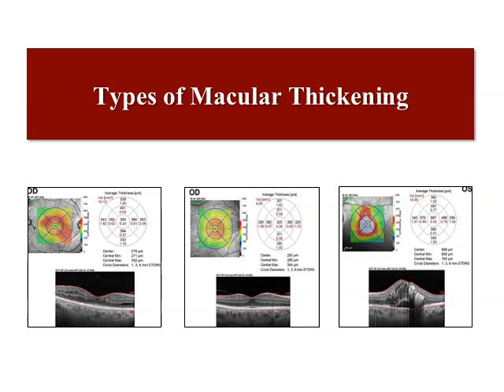For example, this device uses measurement from below the retinal pigment epithelium to the macular surface. That's why we can add 50 micron to the average scan to describe it as normal or abnormal. For example, the fovea is about 300 micron. In comparison with other devices that measure the macular thickness above the retinal pigment epithelium, not below it, you subtract 50 micron from it. For this kind of device, the central subfield thickness is about 300 micron. In the parafoveal ring, it's 350, and in the perifoveal ring, it's about 300 micron.